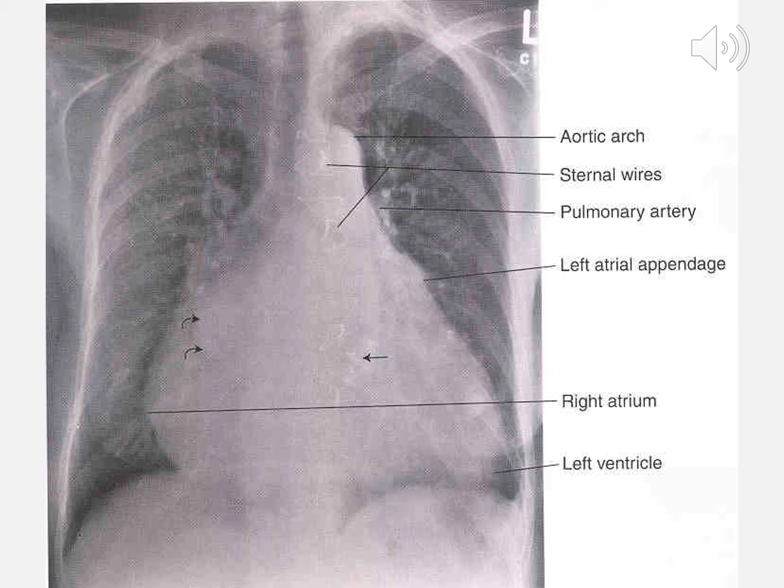You have cardiomegaly." And this cardiomegaly could be due to congestive heart failure. It could be due to long-standing untreated hypertension, or it could be just that this woman takes care of all the village children and has the biggest heart in Tibet. But this is a classic, horrendous example of cardiomegaly. This person has a very large heart.